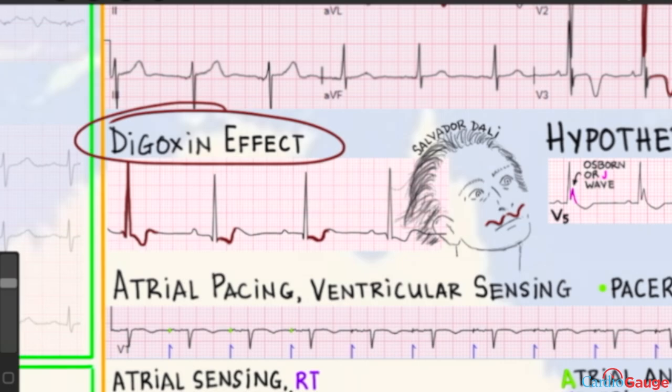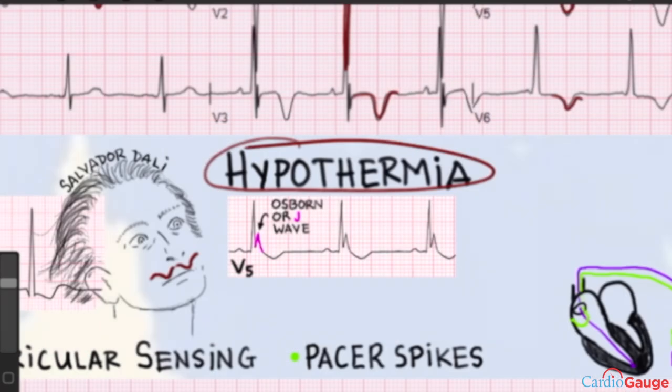All right. Hypothermia. See this one a lot. Patients in the ICU, they had an arrest, now they get cooled, and they get an ECG. Nobody's surprised to see the Osborne wave, that guy. It happens at the end of the QRS typically. It's also called a J wave. So that's what hypothermia looks like, and you could be tested on that.